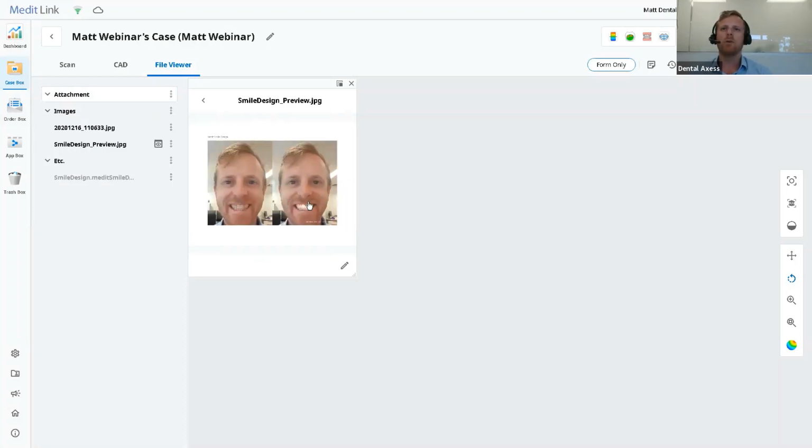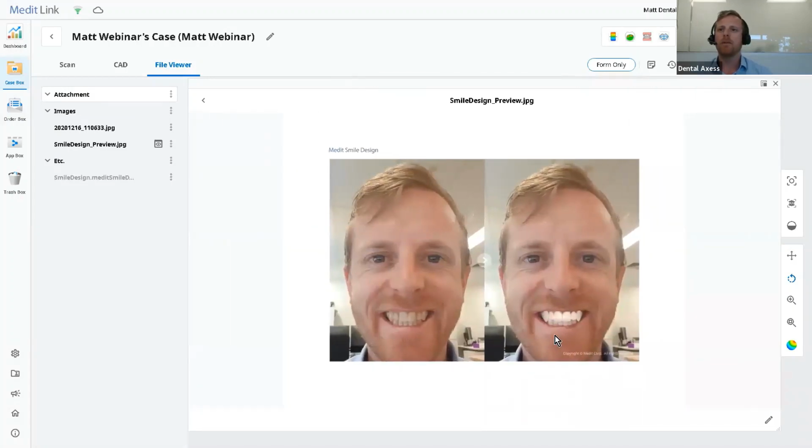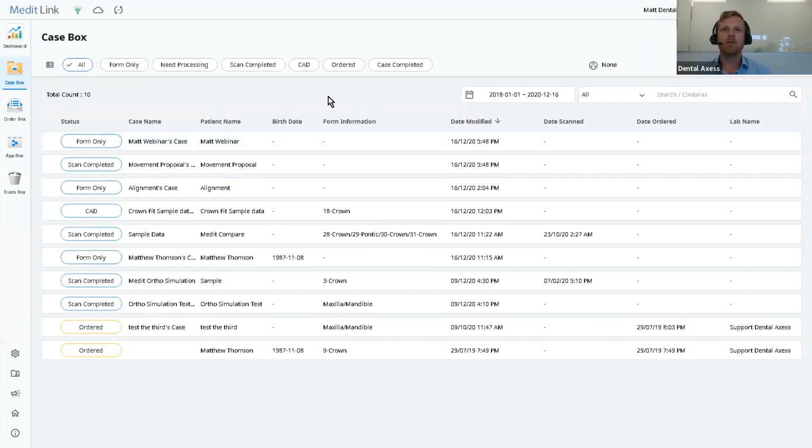Let's open this as well. And I will make this a bit bigger. And you can see there's me as I am and me with some wonderful new teeth. You can send this off to the patient. It's a JPEG. They can get it on email or USB stick or however you wish to transfer it, Dropbox, WeTransfer, etc. But a nice tool to do that. Okay, so that's the Smile Design done.